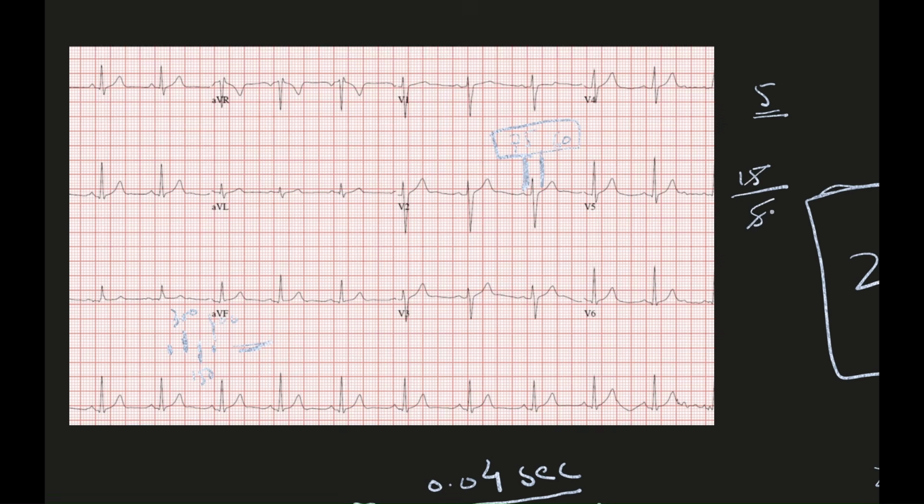That will be divided by 5, which is 3. With simple mathematics, you know that from here to here, 75 to 60 milestone, in between there are the smallest squares, and each square is 3 heartbeats. Each square holds 3 heartbeats in it.